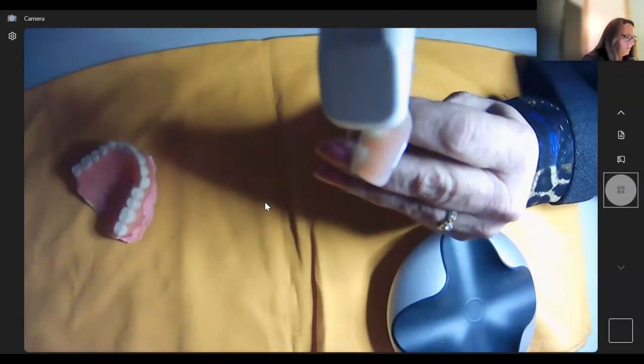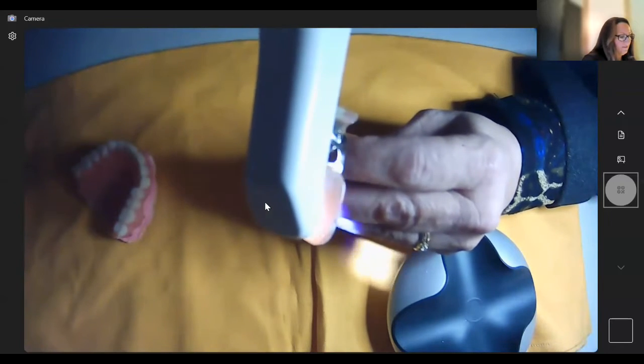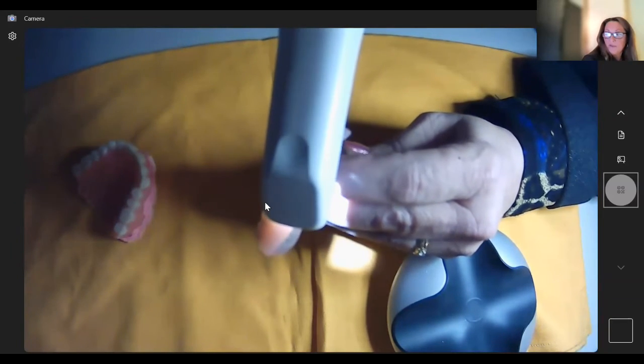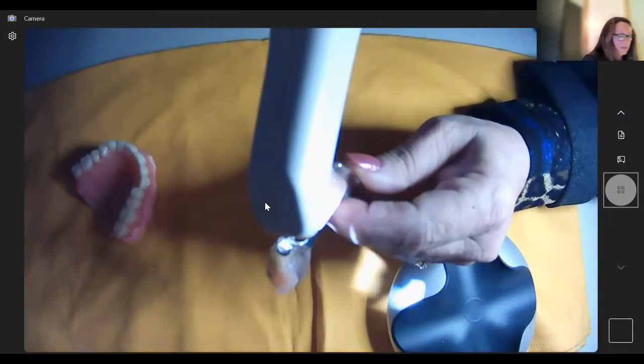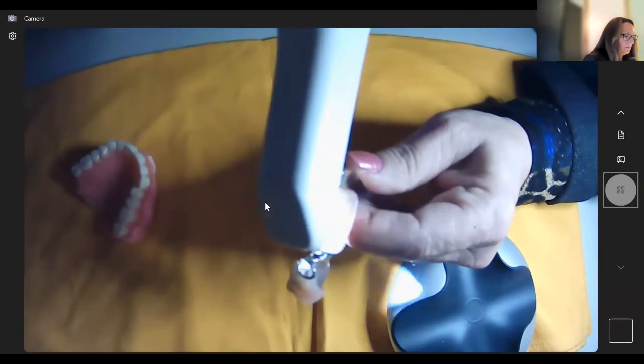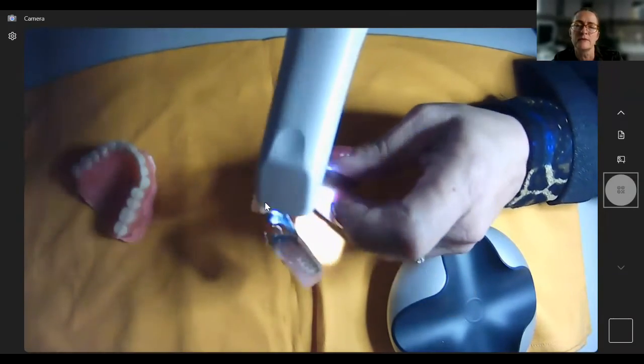And there's a couple little areas there. I wish I could do a split screen with my Trios on at the same time. That would be very helpful. You could switch it back to the Trios whenever it's convenient for you.